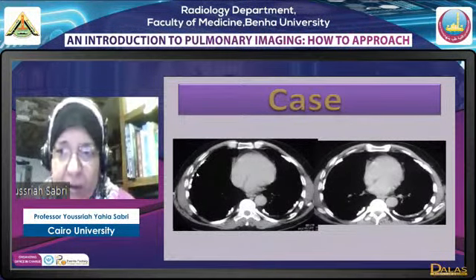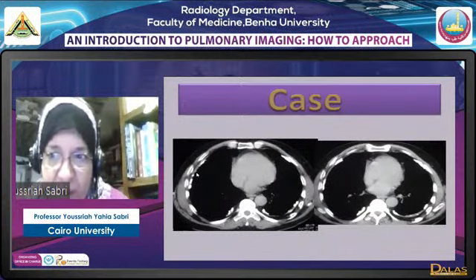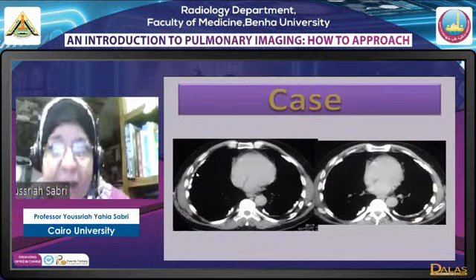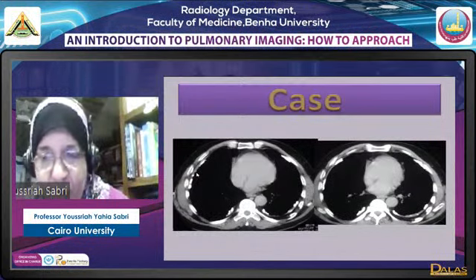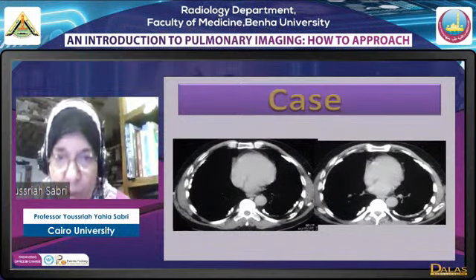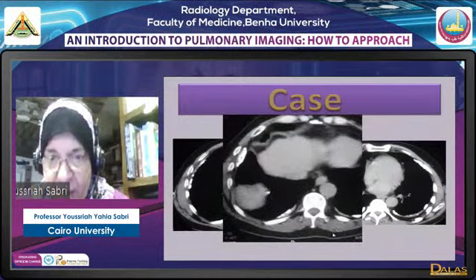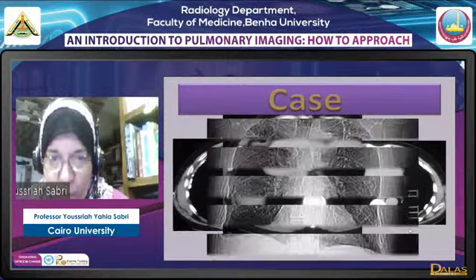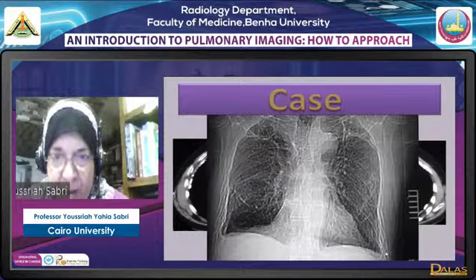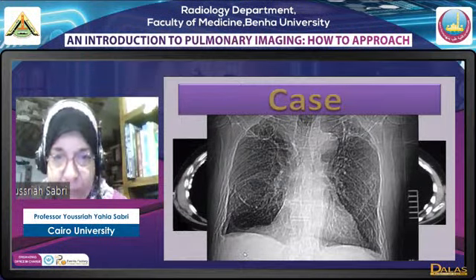They are not interstitial fibrosis. They are only pleural plaques. It is called asbestos exposure. It may be associated with other lesions later on, but by itself, it is not. Bilateral pleural plaques with calcification and diaphragmatic calcification is asbestos exposure. And this is how they will look in the scanogram you see here.